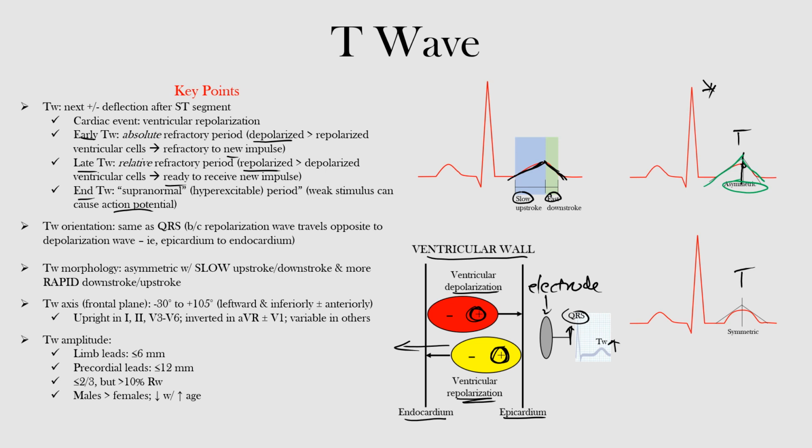here's our T wave. Again, we'll draw a line perpendicular from the apex, the top of it, to the baseline, and then from that, we draw our lines to the peak of it, the slopes, and notice that this side is the same as this side. They are symmetric, and we said symmetric is abnormal and a sign of pathology. Now, the T wave may also be biphasic, broad, or peaked under other circumstances.